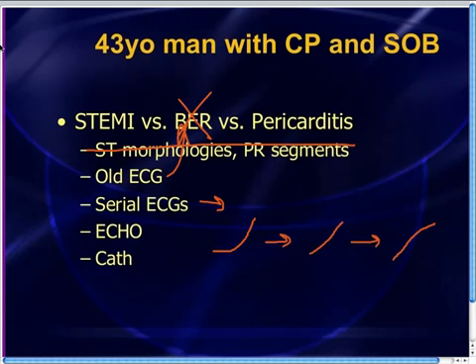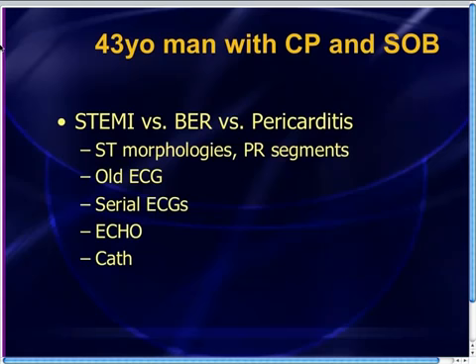All right, maybe the T waves are getting, instead of normal T waves, maybe you're starting to get these hyperacute looking T waves, or maybe they're starting to get very oblique at the beginning. We've talked about that in previous video casts before as well. Any changes in the ST segment or the T wave, that's got to be a STEMI. So that can be very helpful as well, and you're only losing about 15 minutes or so.